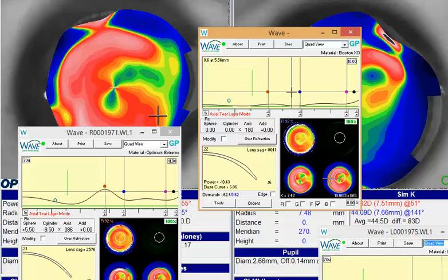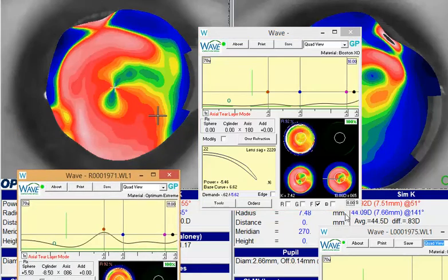I set the 6, about 6, and give it about 2 millimeters to transition along that area. I left it in freeform. But if you notice what I did when I first started this design, I did not average the corneal astigmatism. And you'll see that this lower right hand corner looks pretty much just like your true topography. So I think that'll help get this lens to fit a little more closely.